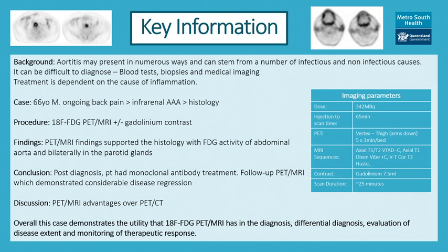Post-treatment, a follow-up PET MRI demonstrated considerable disease regression with no new FDG-avid disease. The PET images provided useful functional and pathophysiologic disease assessment, while the MR imaging offered superior contrast resolution for vessel wall evaluation compared to CT.